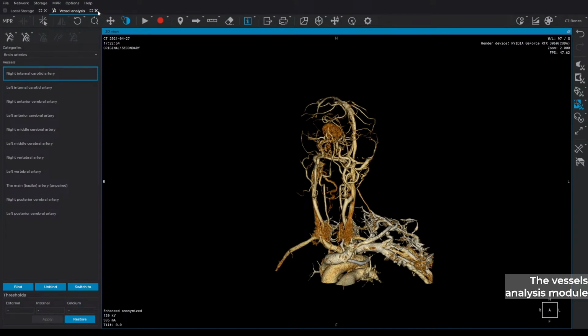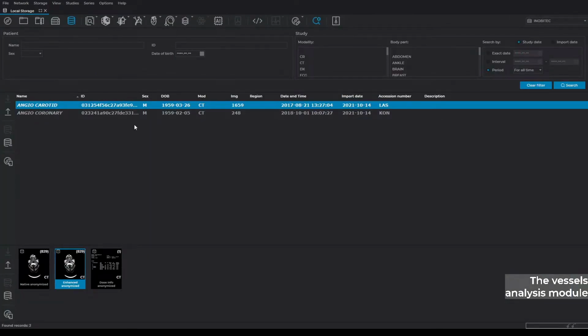Okay, so I guess another thing which can be pretty interesting, because sometimes bioengineers, doctors, and other medical 3D reconstruction professionals face the challenge of segmenting a certain structure with boundaries which are very difficult to see on the 2D image or MPR, or where automatic segmentation tools just do not work properly for some reason.